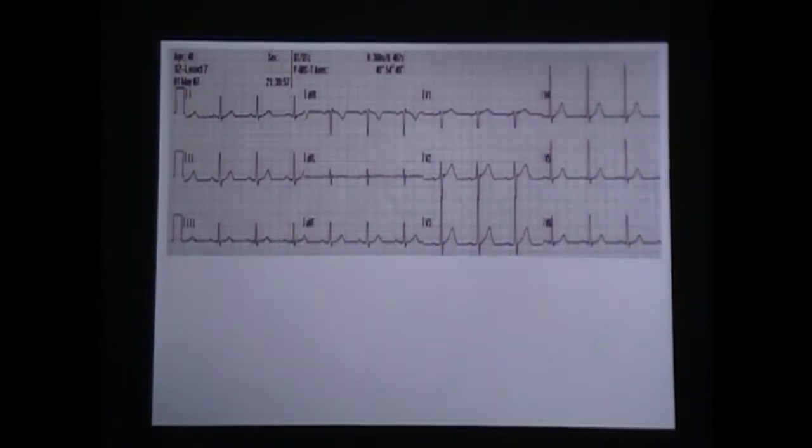So, come on up and look at the EKG. Here's your pointer. Tell me what you see. You're each getting it. The laser is this button. Speak up too. And you guys are all on video too.